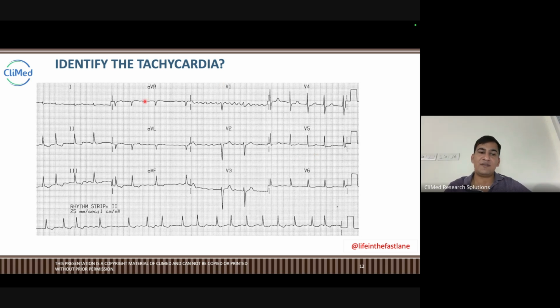Regularity, check the heart rate. Where is heart rate? Here it is around maybe 200. Here it is 1, 2, 3, 4, 5, 6, 7, 8, or 6 or 7. Here it is just 50. 50, then direct 150.